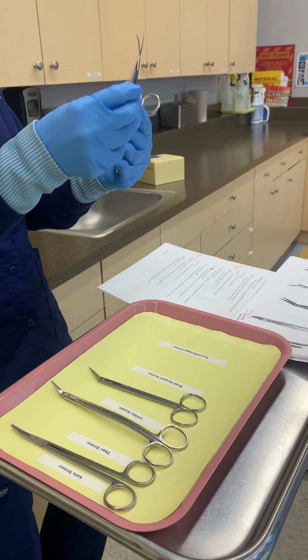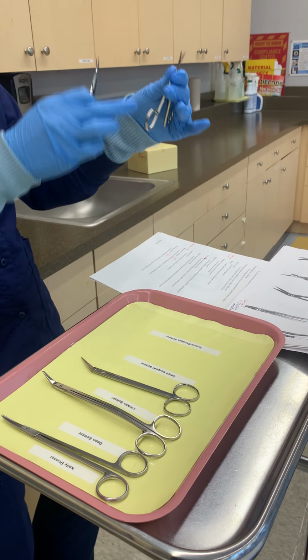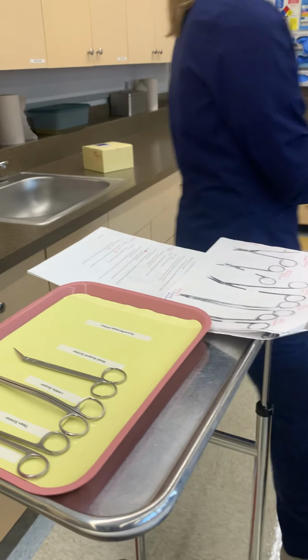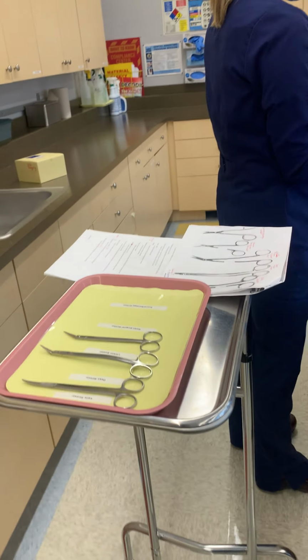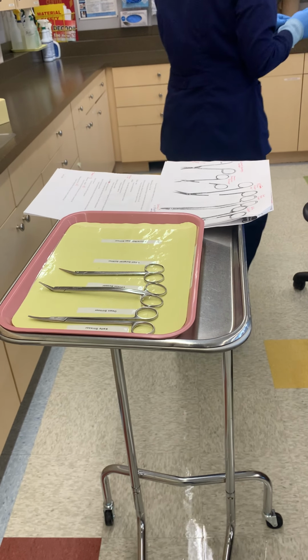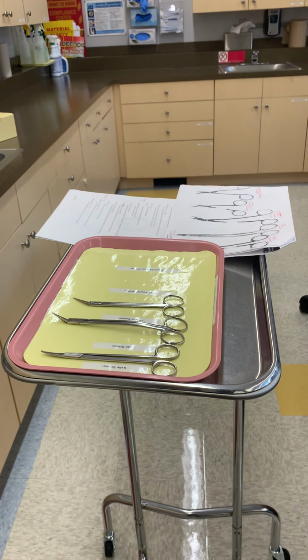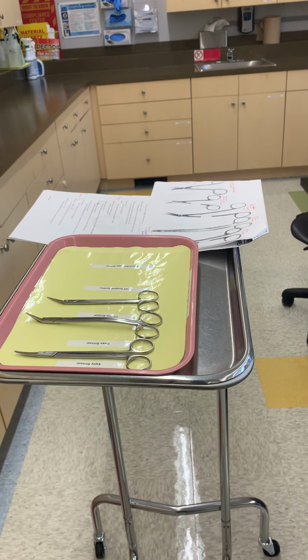If you look, you can see the biggest thing that's different is that notch. Okay, I'll walk around with this. So see the notching there? That's your suture scissor because it's going to go under the suture to snip. Okay. Whereas these are going to be your small surgical scissors. Okay, so right there. See that right there? It has that indent. That's going to be your difference.